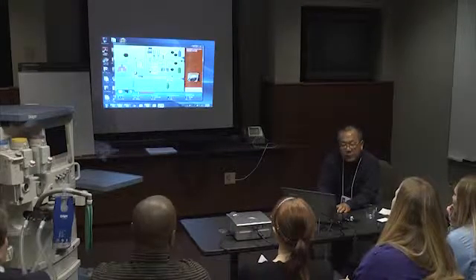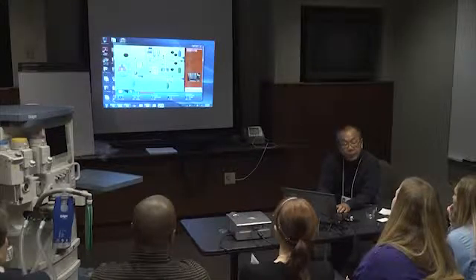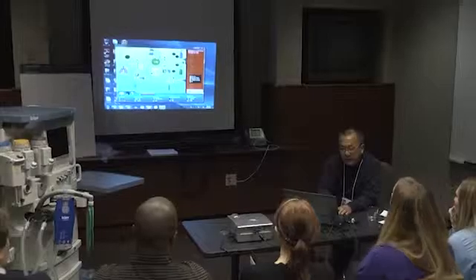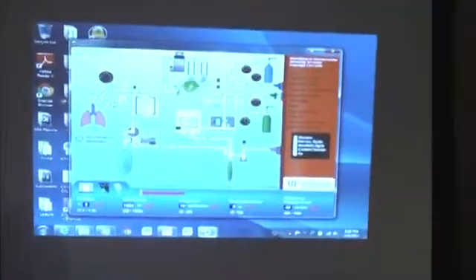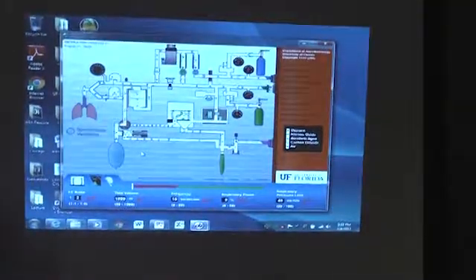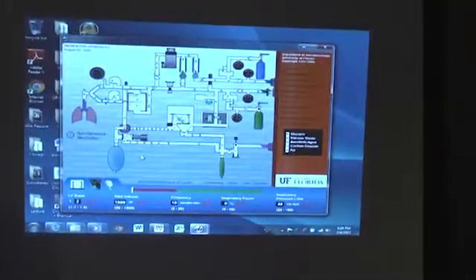So now what is your consumption? It's 3 liters per minute. So you really do have 110 now. And then nobody really needs 3. You can dial it down to 0.5, right? And now you can even have 660 minutes. Because 330 divided by half is 660, right?